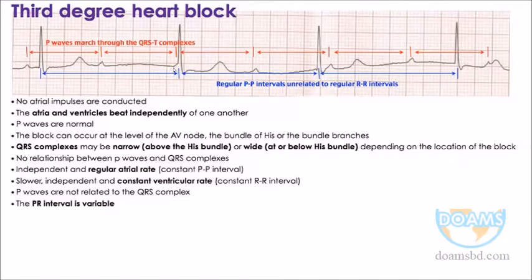The question is whether it is conducted or not. Though it is attached to the QRS, the P can sit anywhere in the tracing. Once P is selected, it is automatically put at the beginning of the QRS. This P is put in the route, and another P also somewhere else. Here you see, this is a P, this is a P, here another P.